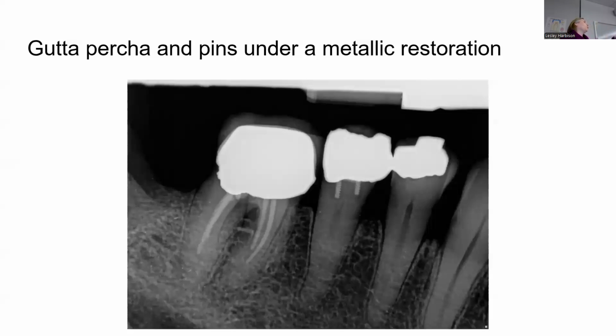So you guys will have more understanding, but we don't have to know it. You just want to know that that is a root canal tooth. That is your takeaway. This is a root canal tooth. You don't need to know much more, but I do want you to look at some.